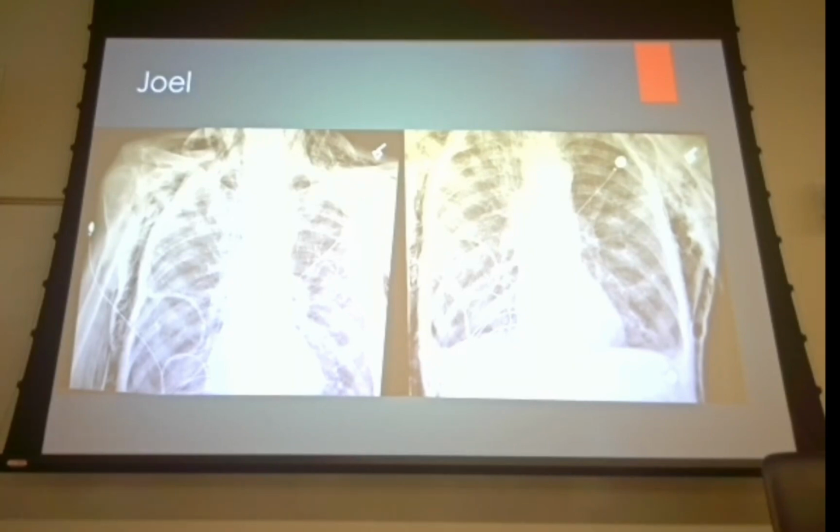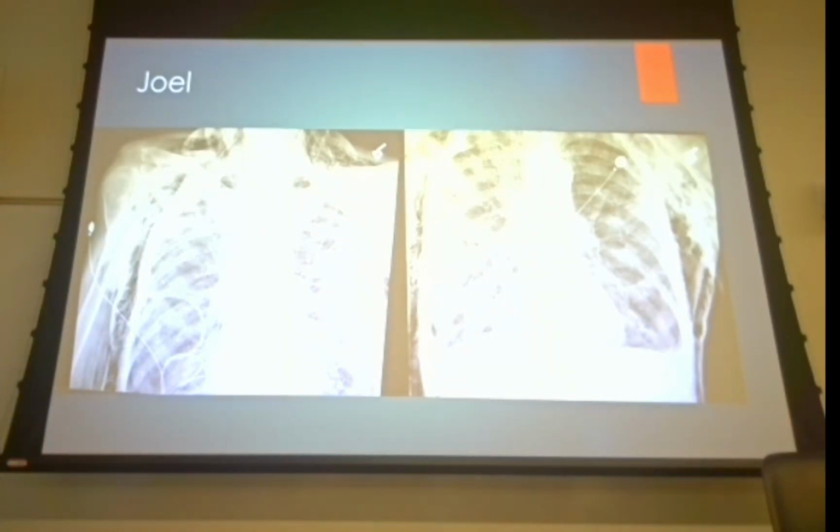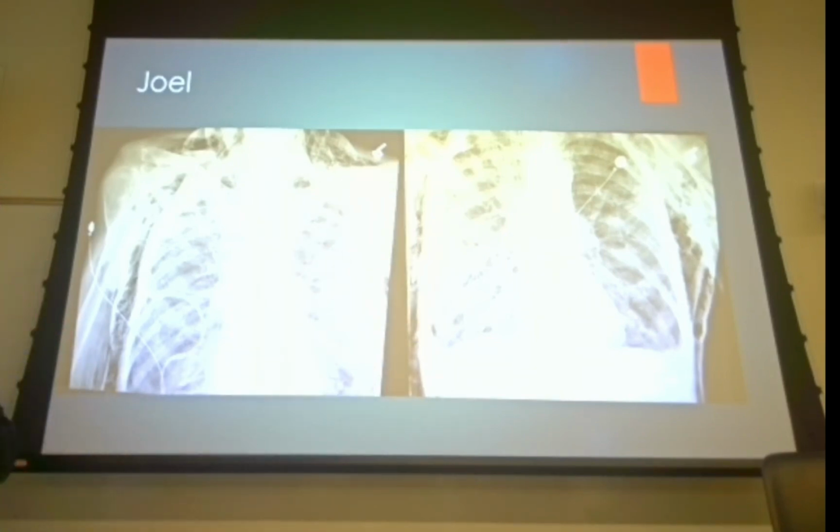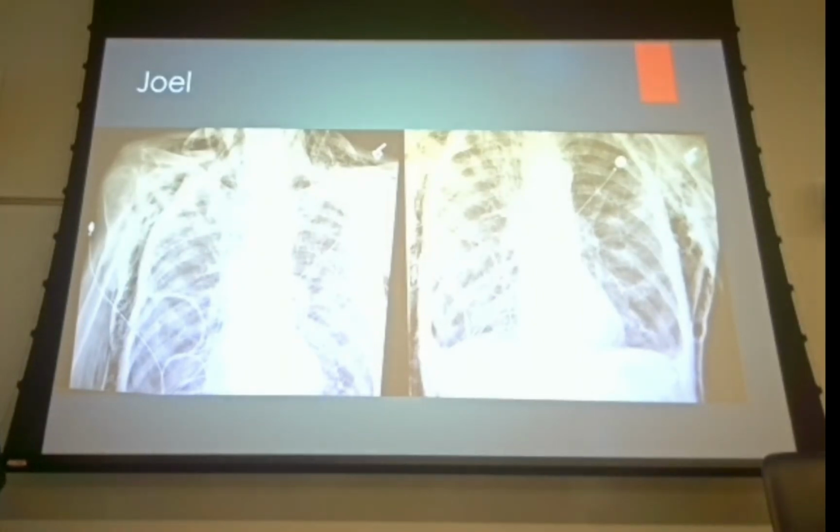All right, anybody seen this? Yes. Trauma situation. Yeah. Did you touch the patient? No. You should have. Put on some gloves and touch the patient. This is what we refer to as subcutaneous emphysema. All right, so it can happen with any kind of a pneumothorax, but you see it most of the time with broken ribs.